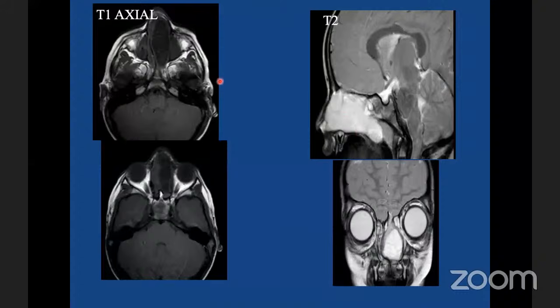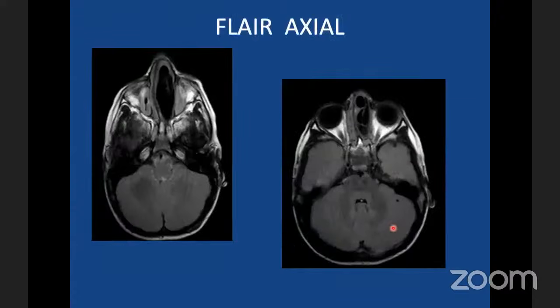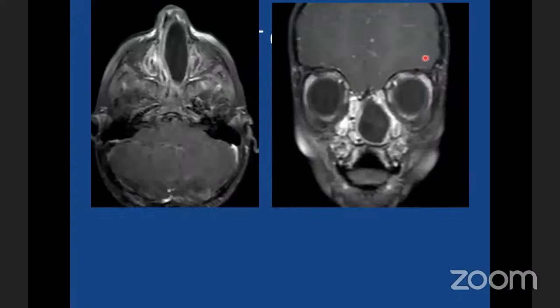So they went ahead and did an MRI. MRI shows that it's a hypointense lesion in the nasal cavity with a few septae. On T2 sagittal and coronal images, you can see hyperintense signal within the lesion, which is involving the anterior nares to the posterior choana. And there is this stalk-like area with a defect which I showed you on the CT scan. We usually don't do FLAIR below the age of 2 years, but in this patient, we did FLAIR to show that this is nothing but CSF because the signals have got suppressed.